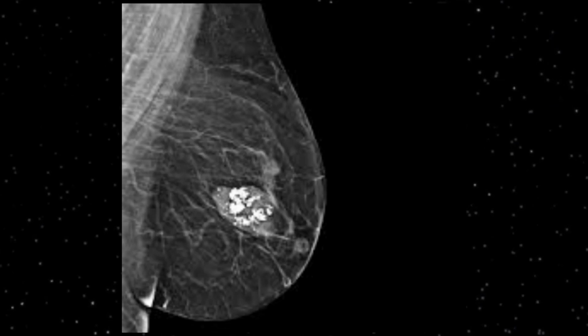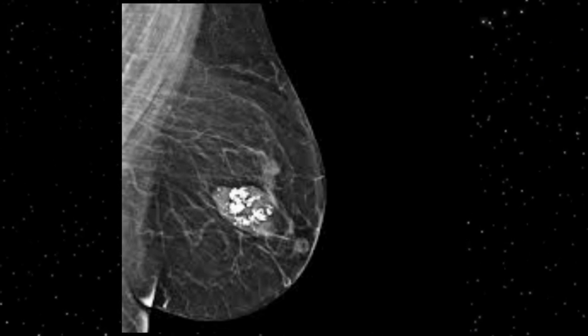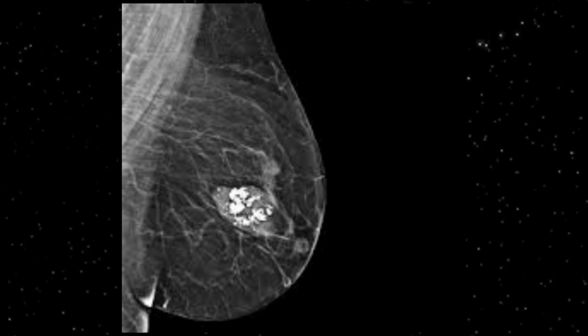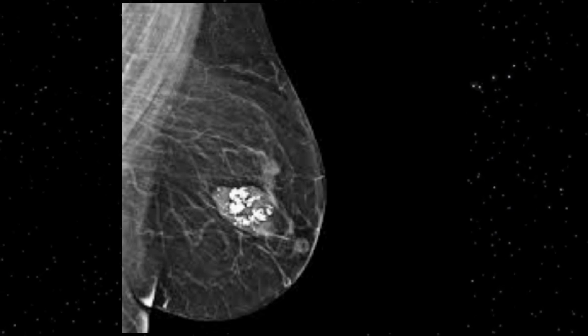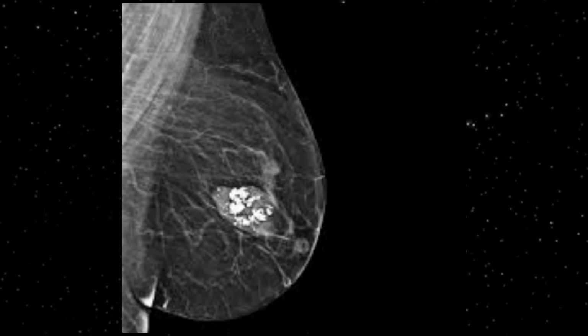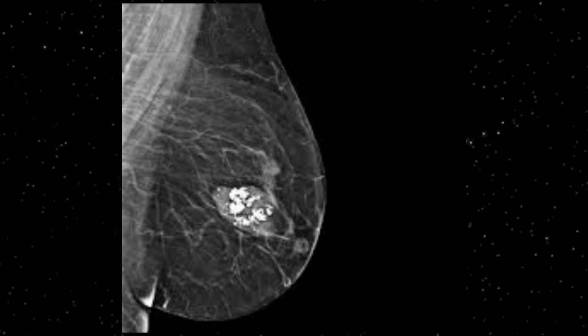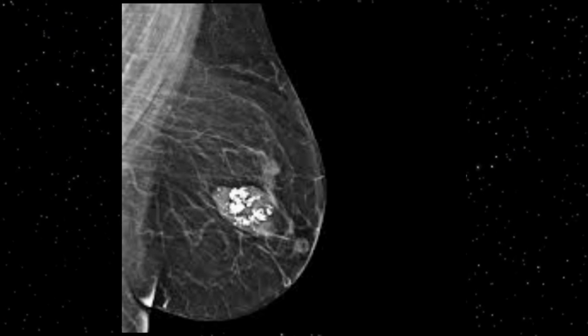This calcification is called popcorn calcification, and this popcorn calcification is usually seen in fibroadenoma, occurring especially after the menopause. Occasionally any calcification is small and punctate, but usually you will see popcorn calcification, which is quite clear on that image, and that is in fibroadenoma.